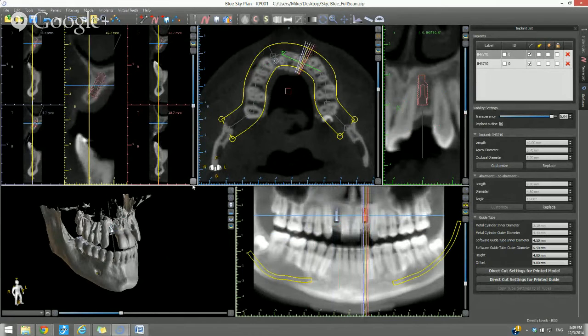So to summarize, the placing an implant functionality is quite straightforward. You identify the relevant location or slice where you want to place it. You press the Add Implant button. You choose your implant from the list, and it's placed there.